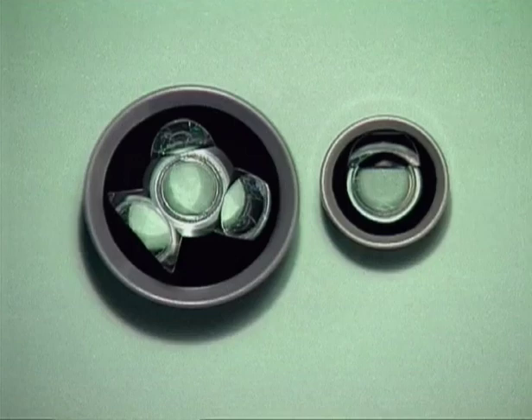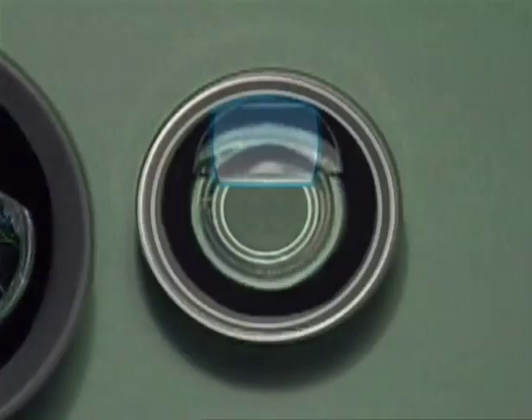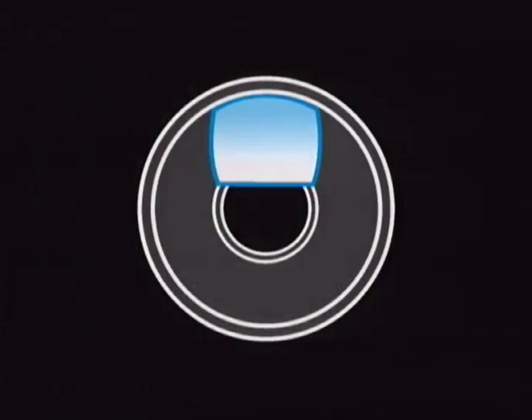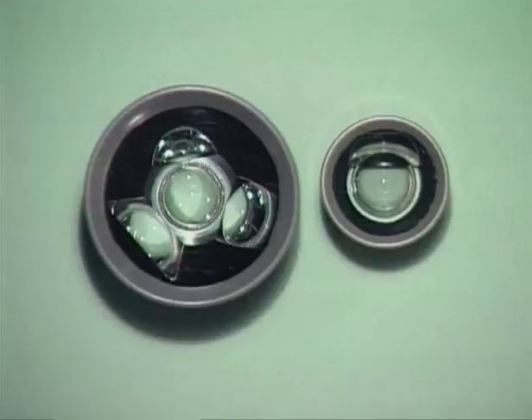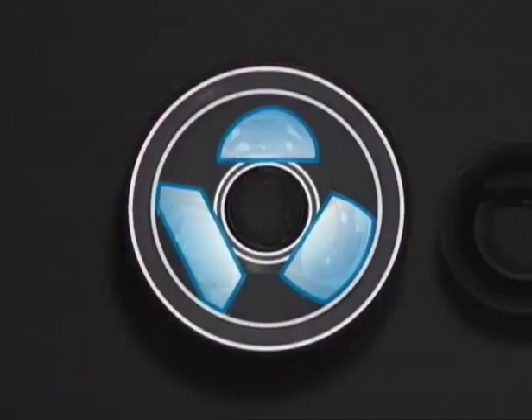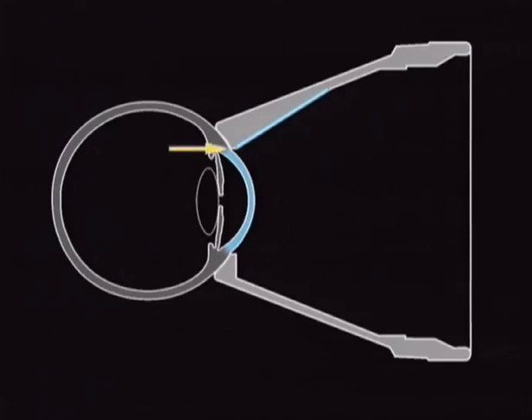The different models of gonio contact glasses vary depending on the position and consequently the inclinations of their mirrors. In gonioscopes, the end of the mirror cuts the corneal contact zone. That is, gonioscopes have an epicorneal mirror. In the three-mirror contact glass, the entire zone of corneal contact is free, and the angle mirror ends at the limbus.